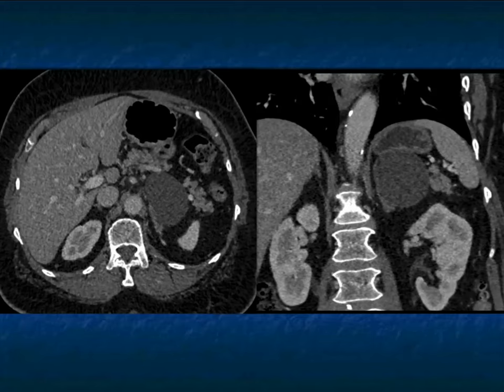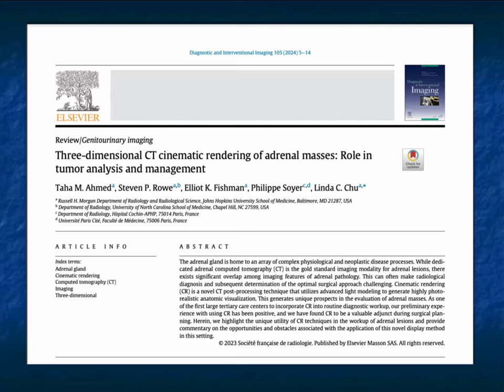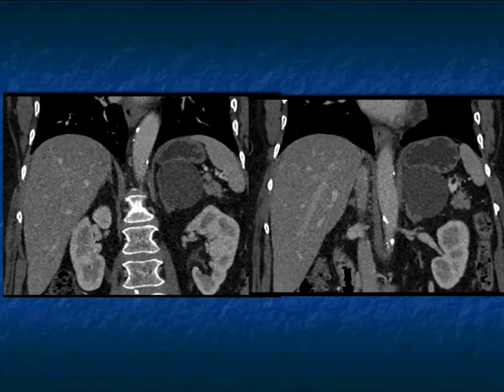The patient had some symptoms and the size was pretty large. And you could see it kind of abuts the adrenal gland, but we thought maybe it was coming off. Well, this patient went to surgery, had it done laparoscopically, and maybe to our surprise, but not 100% to our surprise, it was actually simply a lymphangioma or a foregut duplication cyst. Those were the two things we had thought about, and this was a foregut duplication cyst. So making the point, I think, that you can't always be certain what you're going to be dealing with, but sometimes it's not going to be adrenal.